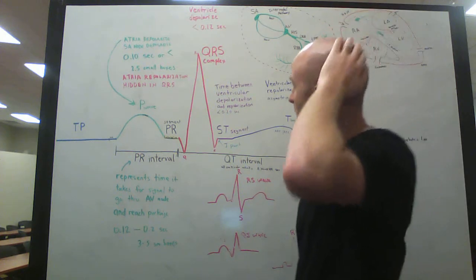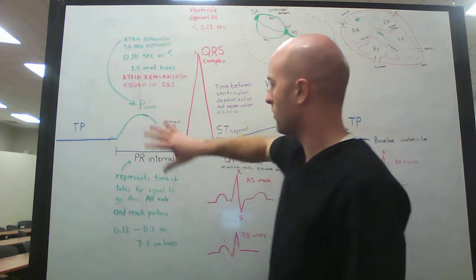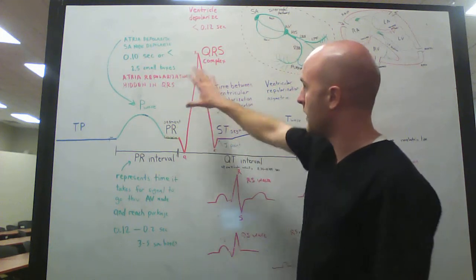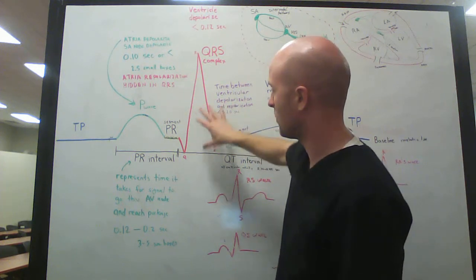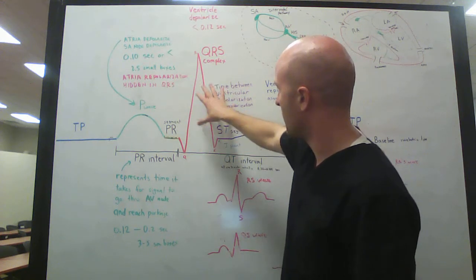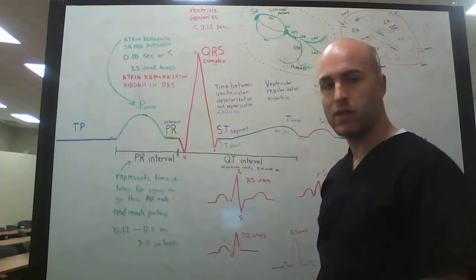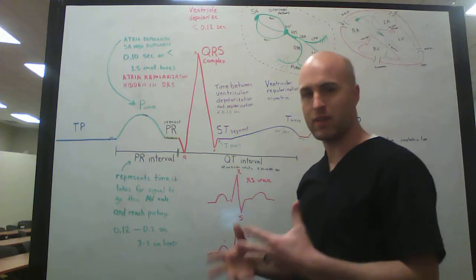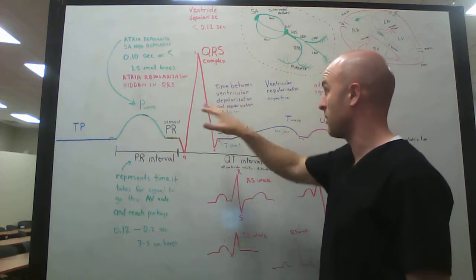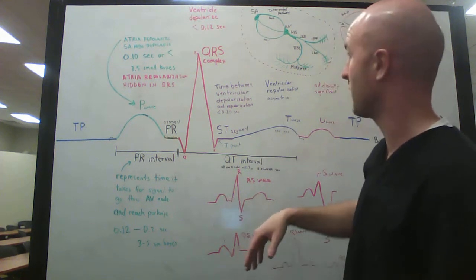And so this is where the atria depolarizes, and you wonder, okay, so where does the atria repolarize in here? Where's that been picked up? Well, it's hidden. It's hidden in here. You can't see it. It's such a small electrical activity compared to the massive ventricular depolarization that it goes on in here, but you can't really see it because this is more dominant. It'd be like whispering when someone else is shouting.